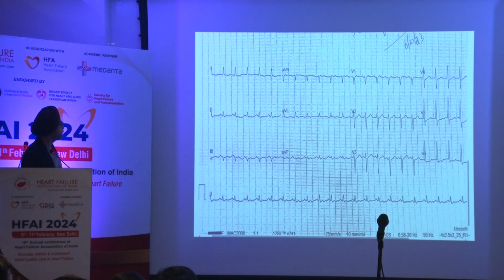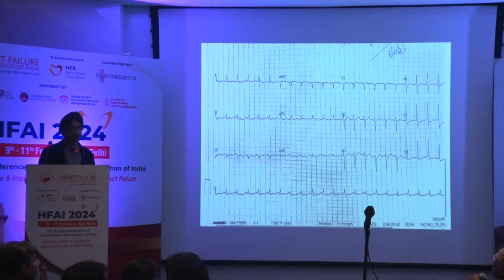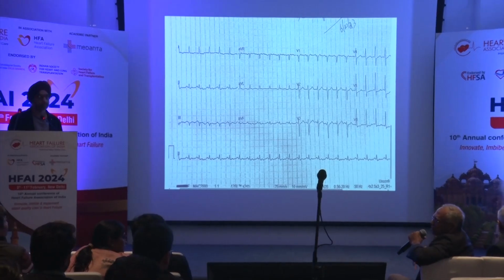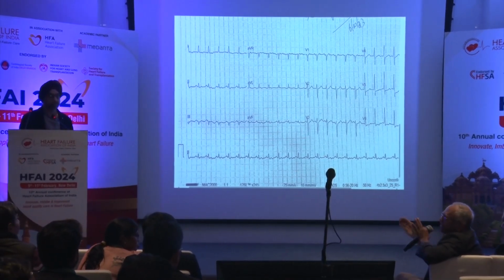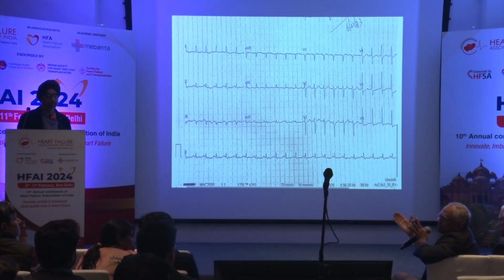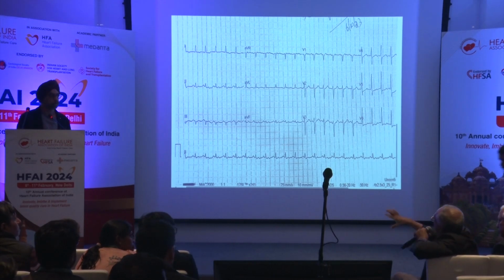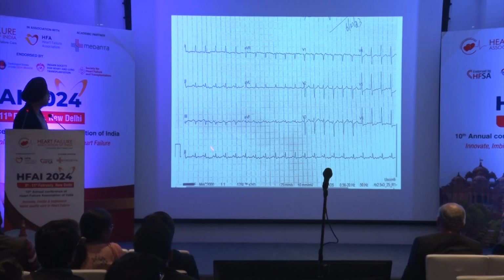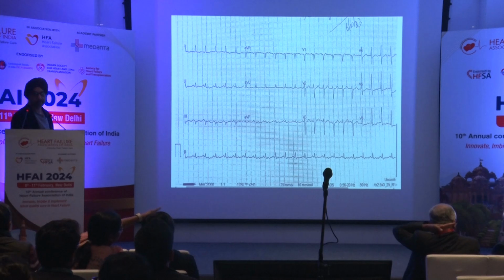That is typically seen in patients with waterlogging. Why? So you measure in bipolar lead the difference in voltage between right arm and left arm or right arm and the left leg. When the tissue water is waterlogged, subcutaneous tissue, there won't be a potential difference. You understand? So the voltages will attenuate. You give some diuretics, patient's heart failure improves, this will improve. So you see, this is called the discrepancy between the limb leads and the chest leads, right?